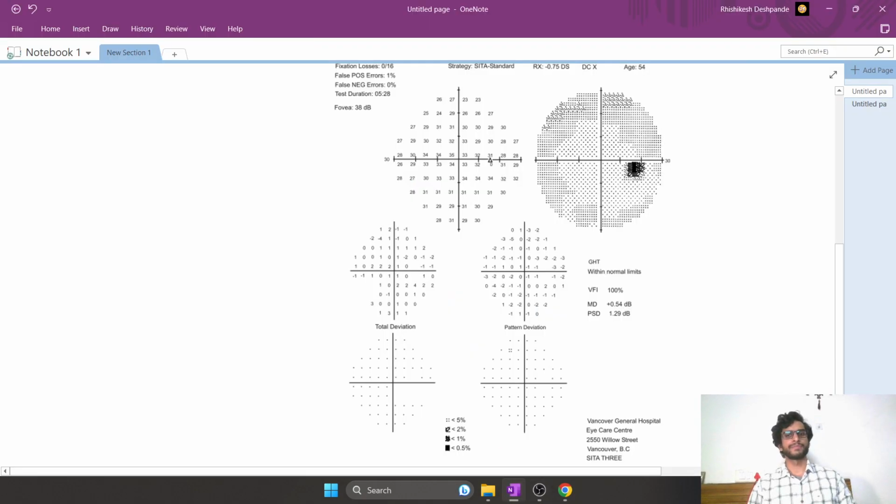Okay, hello everyone. The next few lectures shall be devoted to understanding perimetry. First, the basics. The second lecture would probably be interpretation, and the third would be association between the clinical part of glaucoma and the perimetric part of glaucoma. So, the very first thing that we need to look at is a perimetry report.